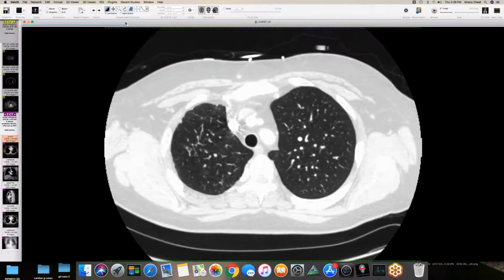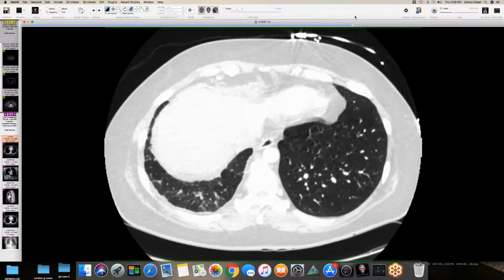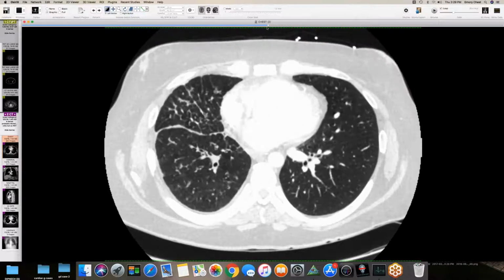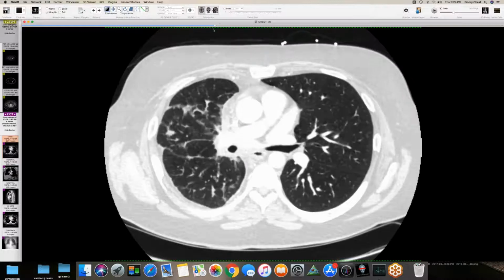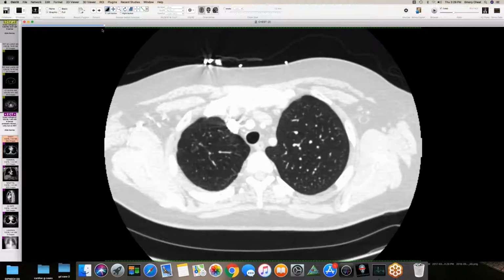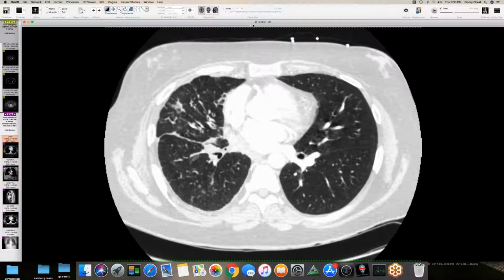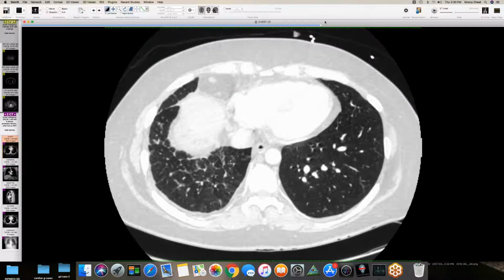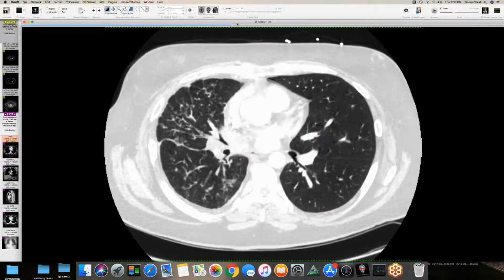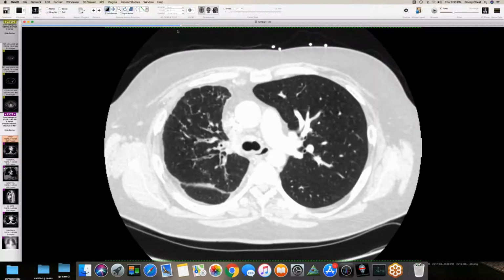When you have lung edema and you get enlargement of mediastinal and hilar lymph nodes, just because they're busy passing a lot of fluid, are those nodes hot on PET? Could this be a response to fluid accumulating in that lung because of the obstruction of the veins? I don't know. I haven't really noticed that as a phenomenon yet, but not that hot. And we didn't have bronchial obstruction here enough to cause any infection in the lung or something that might cause the nodes to be active. There's a little bit of narrowing, but not obstruction.